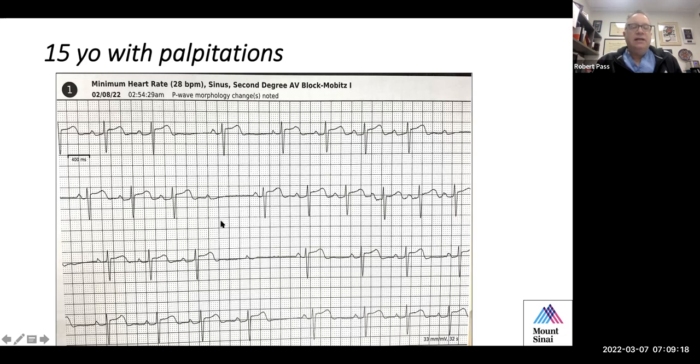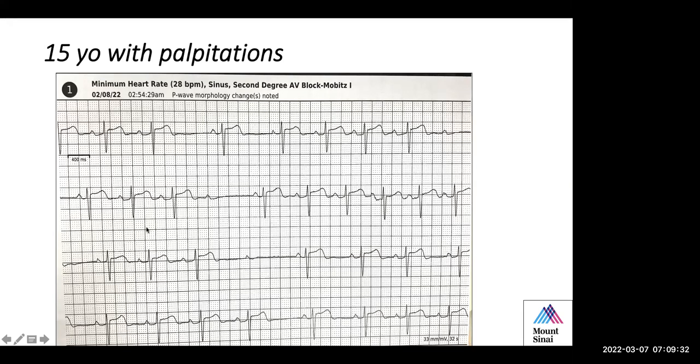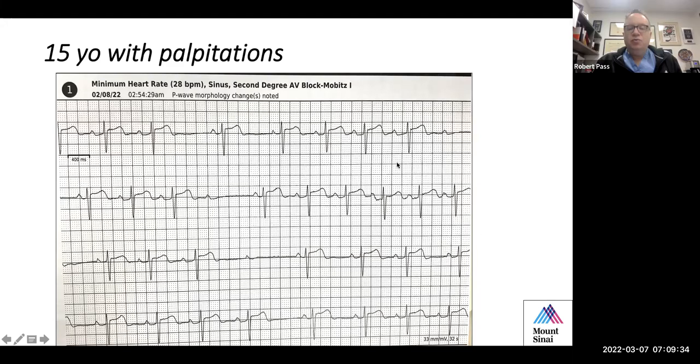What I'm trying to get at here is that Mobitz I during sleep is a normal finding. And I'm sure all of you, when you review the tele on the patients in the ICU, have observed this on occasion. One of the nice things about this tracing is the grouping of beats. You see how we have 3 beats conducted, then a pause, 3 beats, pause, 4 beats.